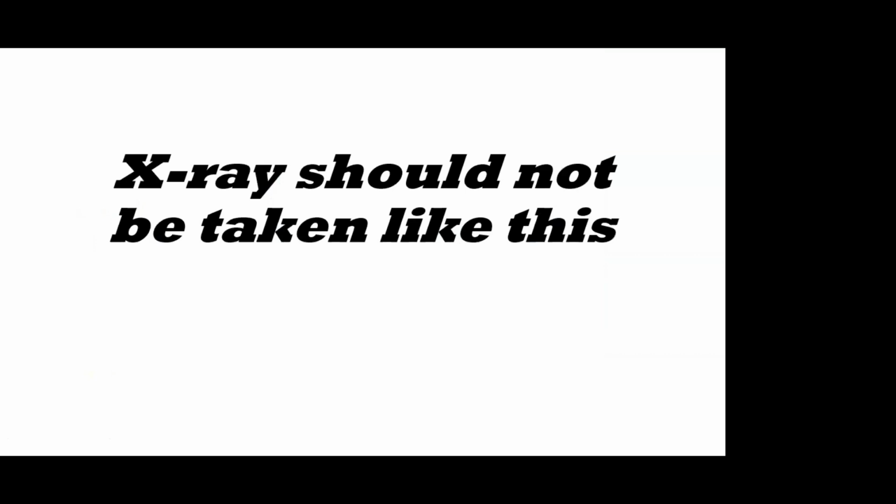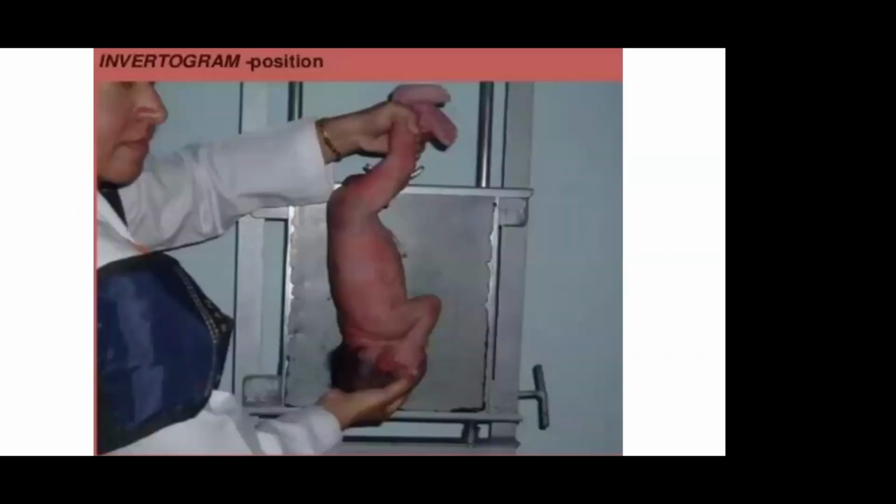An X-ray should not be taken like this. Here are a few examples of what you should not do. This is an invertogram, a classic invertogram, which people used to favor, and still many pediatric surgeons do favor this kind of invertogram. It is not in practice anymore, but this is what you should avoid.